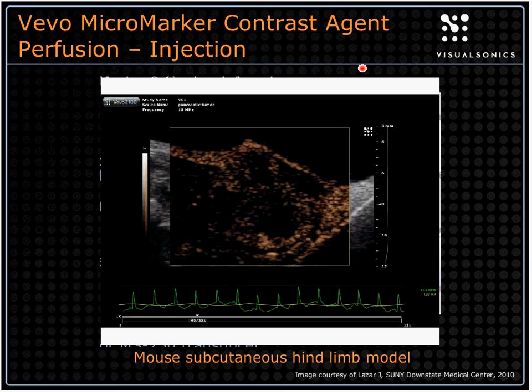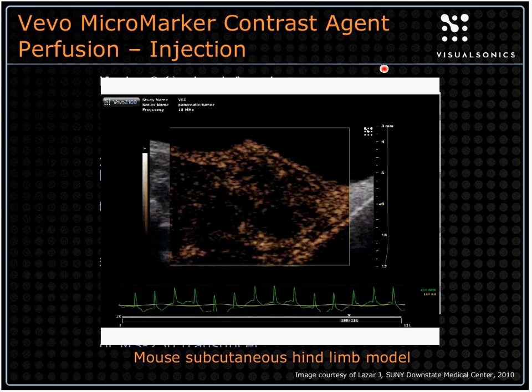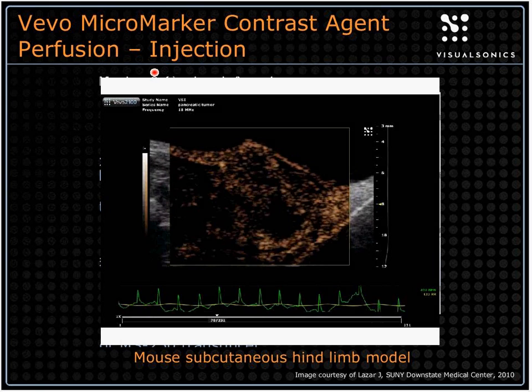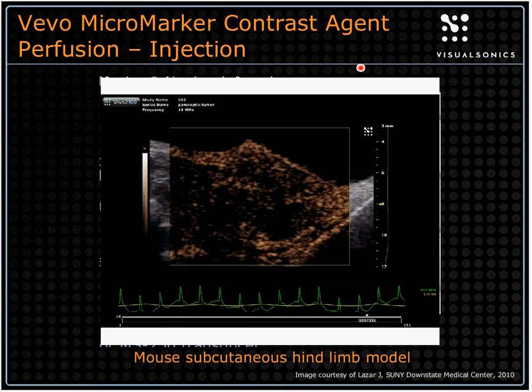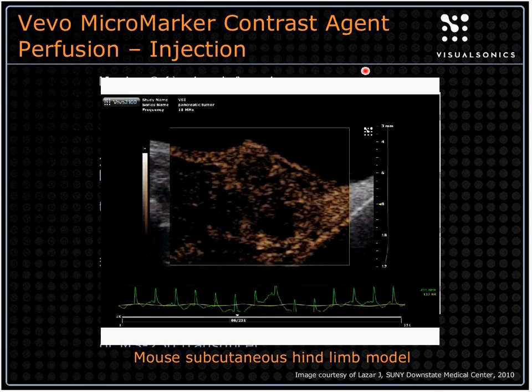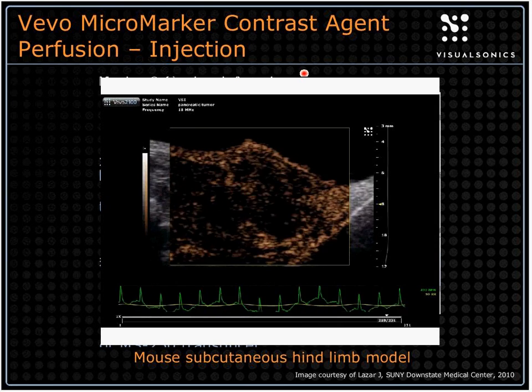The gray on the left and right side is your B mode image. So in nonlinear contrast, the nonlinear contrast signal, the signal from the bubbles, is being co-registered with the B mode signal. So this allows you to see anatomically in B mode where you're looking, what you're looking at, and then looking in the nonlinear contrast mode where you're actually able to see the bubbles flowing in.